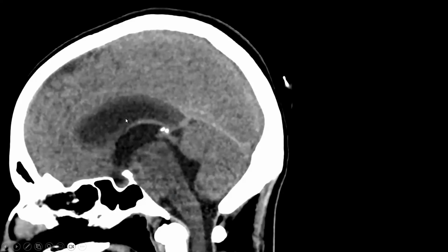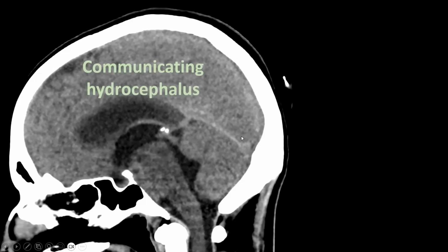And what is the cause? Well, lateral ventricles, third ventricle, fourth ventricle, the cerebral aqueduct looks open. This is a communicating hydrocephalus because all ventricles can communicate with one another. The foramen of Magendie looks open. So where's the compression? Let's look at the MRI image.